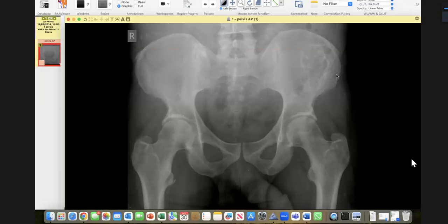So it's not a must that it will be only ground glass. The key finding is the marginal sclerosis. Now, look at how thick the margin is. It is very, very thick. And this is known as rind of orange appearance, quite pathognomonic for fibrous dysplasia and nothing else.